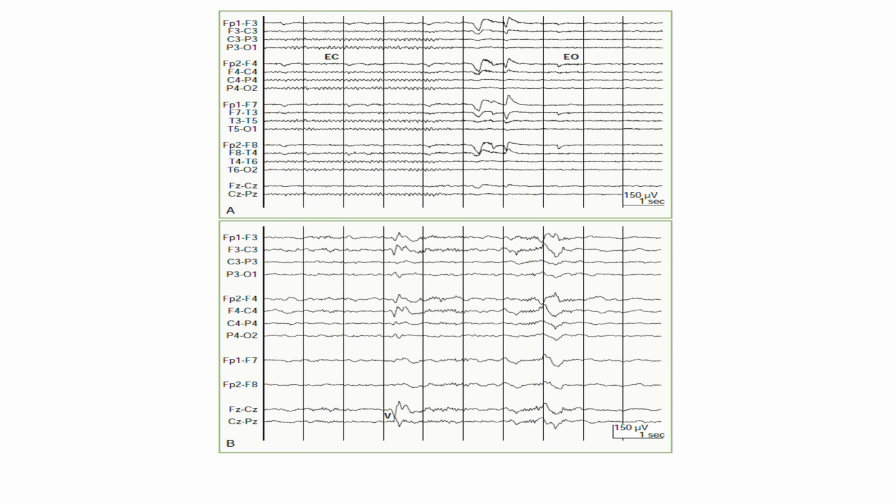First, look at that sharp, diphasic dip marked with a V, right in the midline central channels. That is a vertex sharp wave, a classic transient of early sleep. Then, scan across the frontocentral leads and you will spot these beautiful, tight bursts of waxing and waning sinusoidal activity humming at around 12 to 14 Hz for just a second or two. Those are sleep spindles, generated by the thalamus gating out the external world. When you spot those spindles, you know with absolute certainty your patient is soundly asleep.